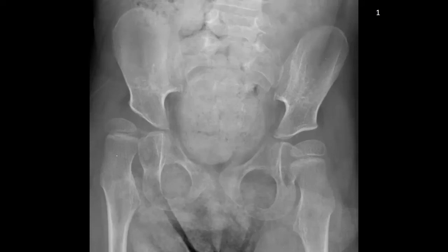And then in a horizontal format, in a landscape format, go ahead and take the picture. And that's key. The landscape format really allows you to get the full AP pelvis visualized and makes it easiest for the analysis. So you would press the camera icon and take a picture and then say use the photo.